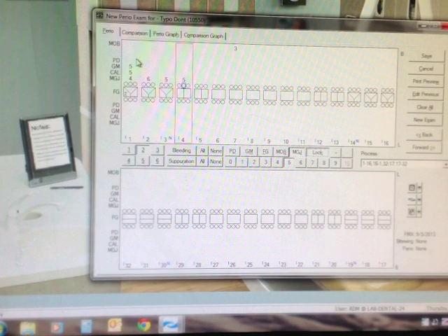5. If you have to go back and change the reading for a tooth, you're able to hit the back button and change it. For example, I am changing the reading for tooth number 3 to a 6. Then I'm able to hit the forward arrow and continue with entering my values. After charting everything for the perio chart, make sure you click Save. This will make sure that the data that you have entered is saved.